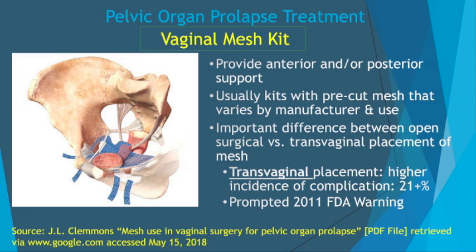However, more recently, we now have pre-cut kits, so surgeons can just fit it into the pelvis, and the shape of the kits just depend on what it is they're trying to treat. The image on your left, again, is a schematic just showing a kind of way that this particular mesh fits behind the organs, and you can see here tends to be flat and very, very thin.